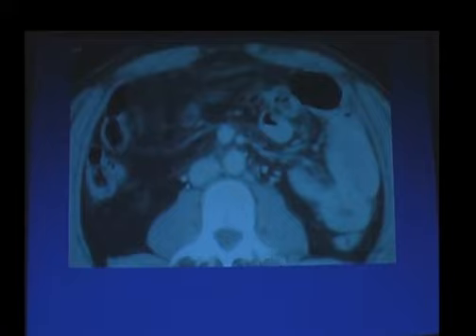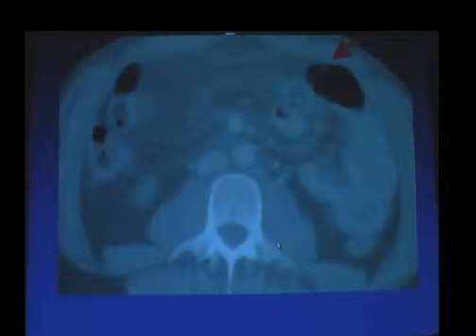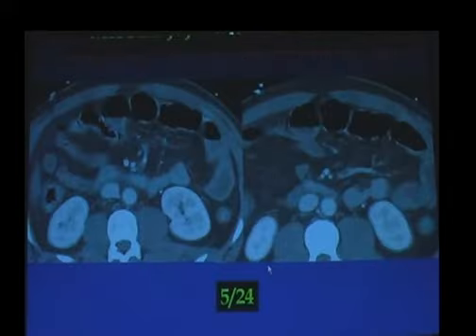And it always helps to look at these patients not only on your normal windows, but look at them on lung windows because it helps to pick up subtle pneumoperitoneum and subtle pneumatosis. This is a patient who is a roofer who fell off the roof, came in complaining of abdominal pain, and you can see the circumferential high-density thickening of these jejunal loops in the left upper quadrant due to the intramural hematoma. But in addition, when you look on lung windows, it's easier to see that this patient has a small amount of extraluminal air here due to disruption of the jejunum.